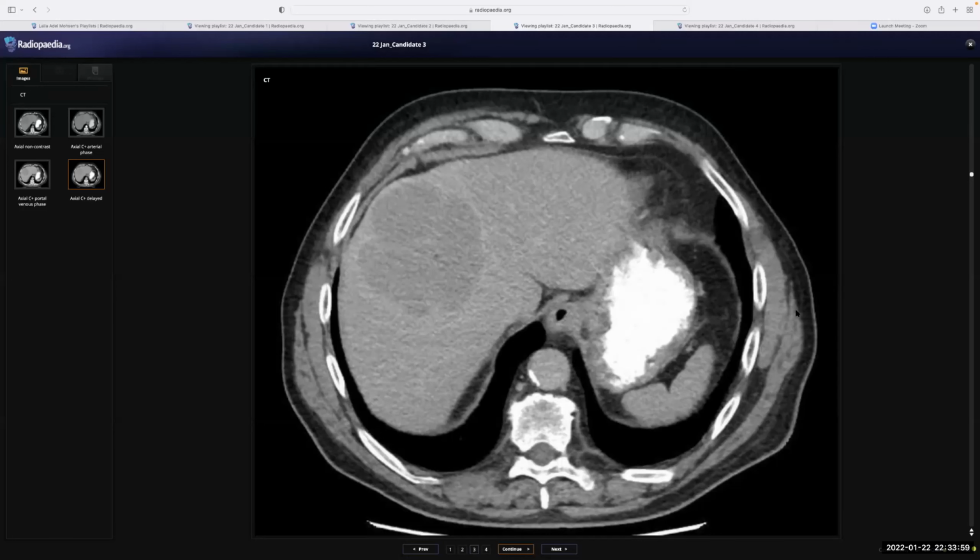However, cystic hemangioma is also another possibility. But I will ask for the clinical picture of the patient, whether he is febrile, in order to know whether it is amoebic or parasitic, I mean hydatid.